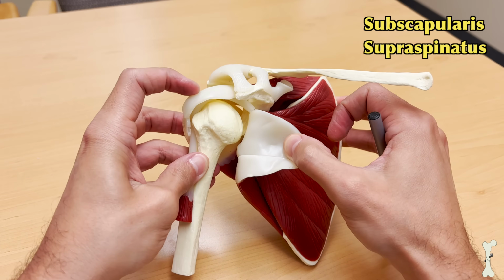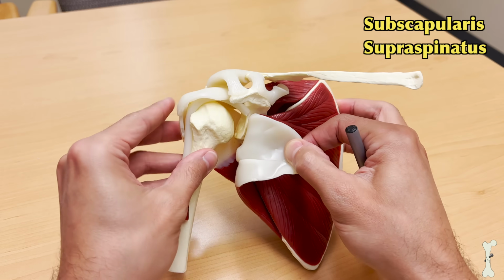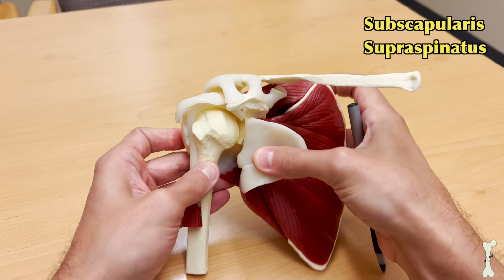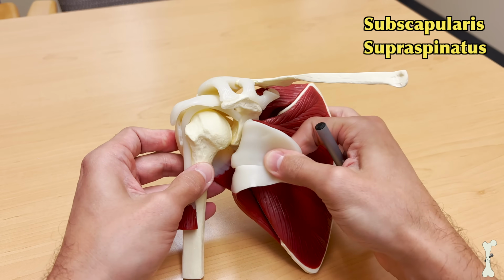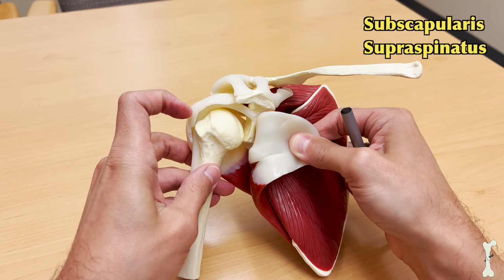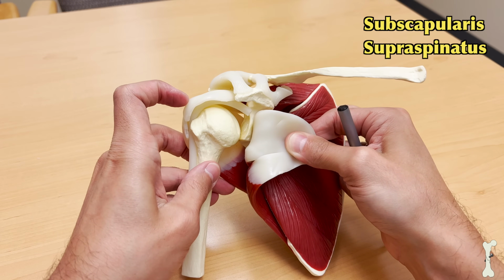You can see the supraspinatus muscle comes along the top and attaches right through here. And so this will be an important view because this will allow us to see what a coronal MRI looks like in just a second. So that's the supraspinatus muscle as it comes along the top of the ball part of the ball and socket and attaches here.